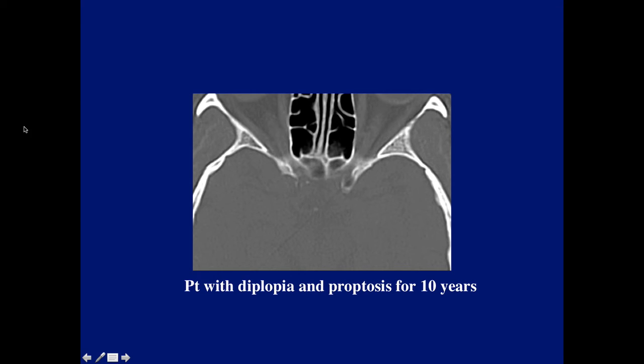Okay, what is the abnormality here? Patient had diplopia and proptosis for 10 years. Finally decided to find out what's going on. Anybody see any abnormality?